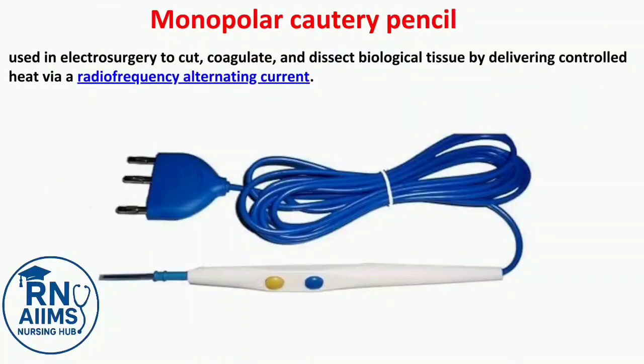Monopolar cautery pencil. Used in electrosurgery to cut, coagulate, and dissect biological tissue by delivering controlled heat via a radiofrequency alternating current.